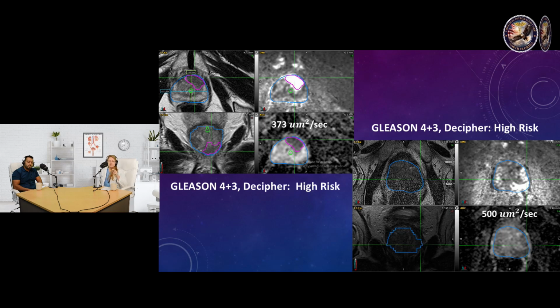So then you can see that on the T2 weighted image, it was a little bit challenging seeing anything, and I'm not sure if this was a defect from the scanner, or sometimes I get patients that come from different places and they have their own MRI discs. So when you look at the T2 weighted image, you really can't see much.